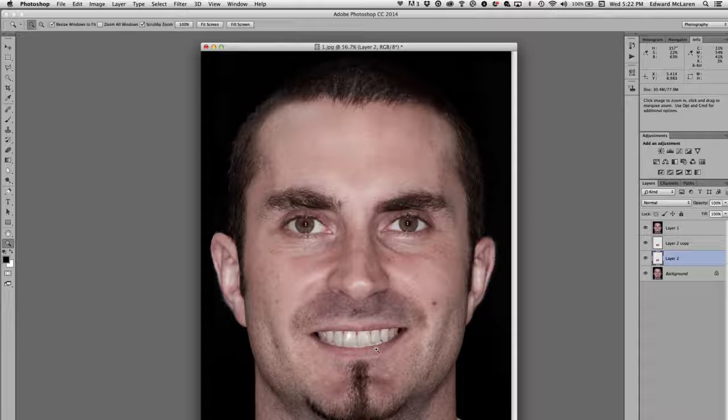And then if this person doesn't like this particular smile, doesn't like the shape of the teeth, then certainly you can change it. You can change anything. I'll just show you one other quickie. So let's just say this was the one that you decided you want, the one on top.